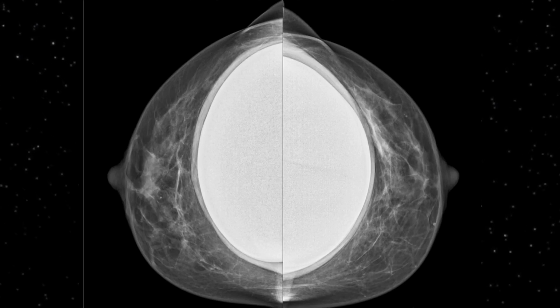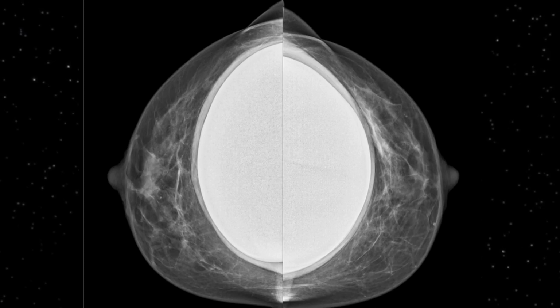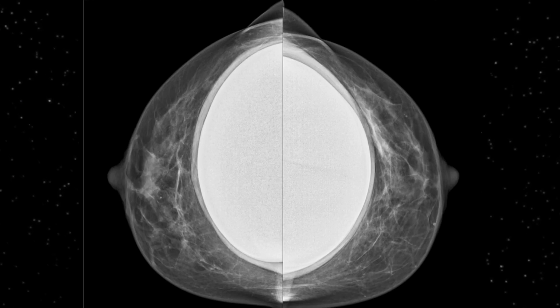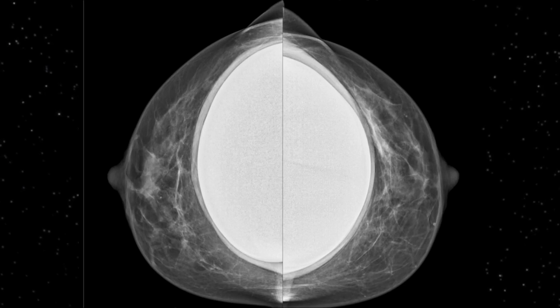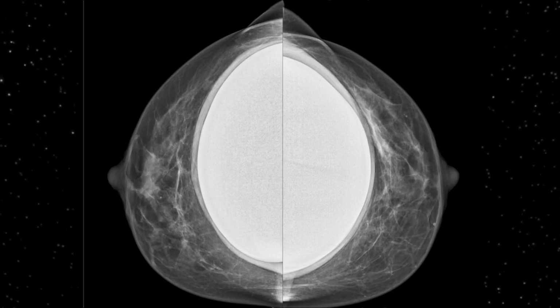To appreciate all this integrity you have to have the ultrasound technique, and this image is showing you a subglandular, or in other words retroglandular, implant, properly placed, and there is no abnormality related to the implant. This is how the ultrasound image will look on the mammographic images.